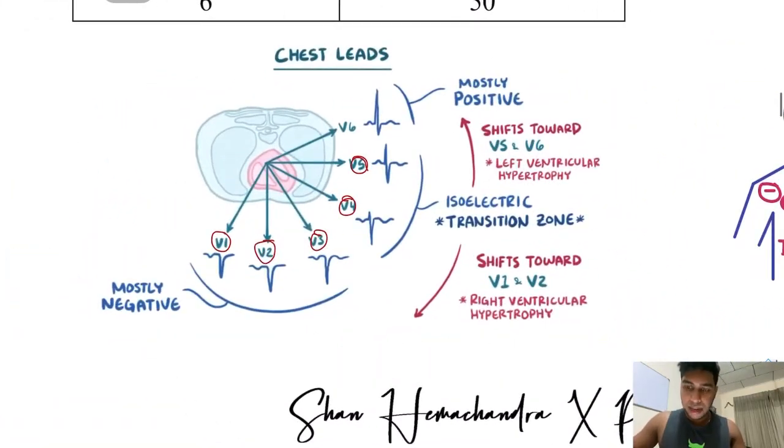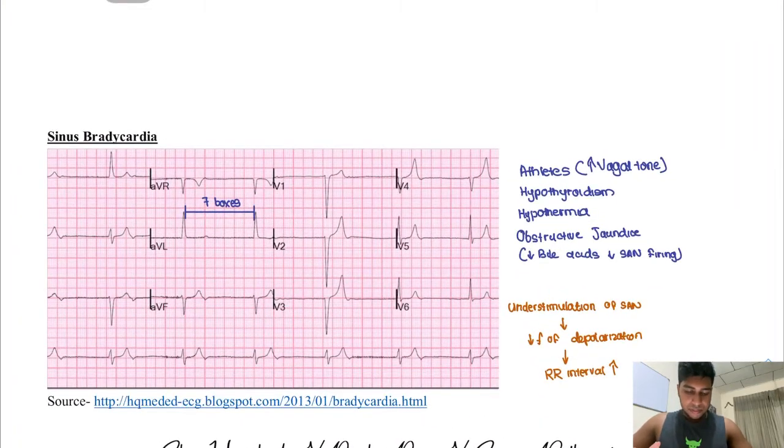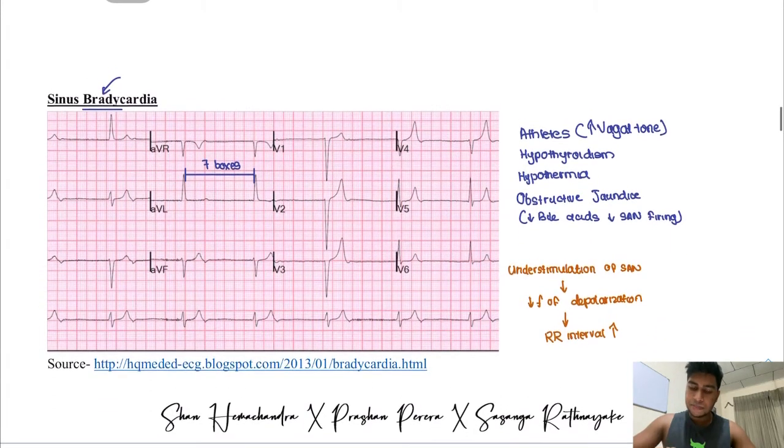This image, I will come back to that next. So these gaps are for the parts that Prashant did in his lectures. You can fill that in. Sinus bradycardia. What does brady mean? You will hear this word in a lot of places, mostly related to the heart, but even for diseases such as malaria, you get bradyzoids.